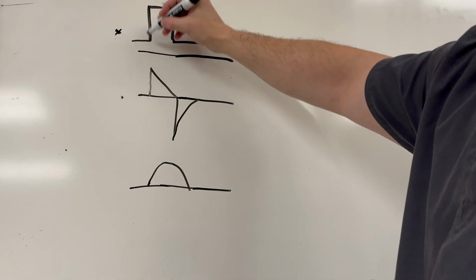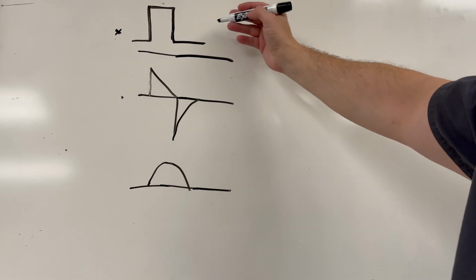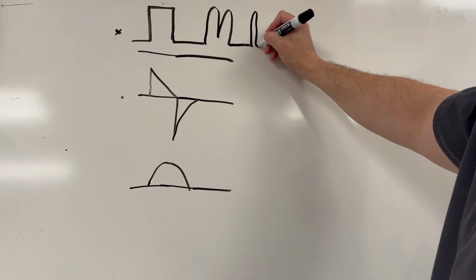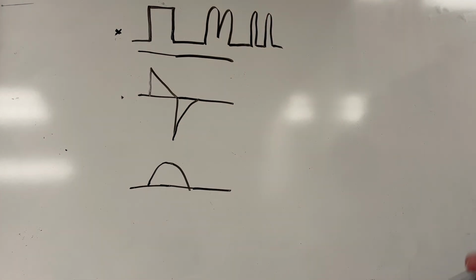Instead of it going straight up and making a smooth plateau over and then coming back, it's going to go up and then kind of look like this. And I've even seen it look like that, where they're separated out a little bit. For me, I call this the McDonald's sign, or bunny ears. If you see that, again, most of the time it's going to be on non-invasive, so go reposition your patient and see if you can make it go away.